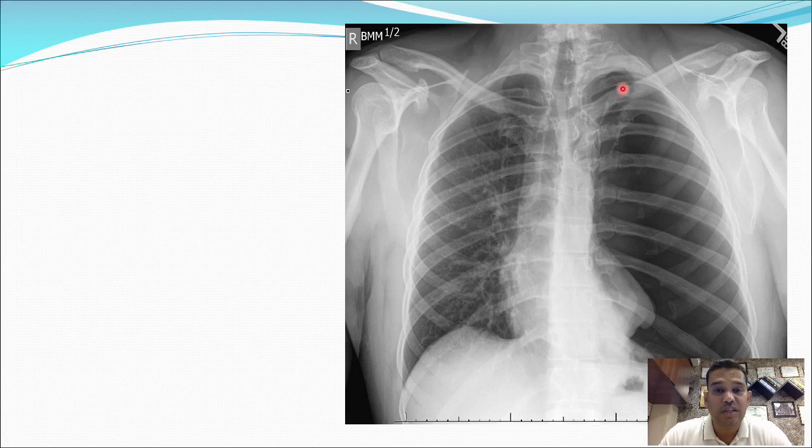Okay. Now the bony: do you see any bony problem? You trace the ribs. So the ribs and clavicle seem to be okay. This is also okay. Then these are the ribs. I could trace the ribs. There is no fracture, no breach in the continuity of the ribs. I could not appreciate any.